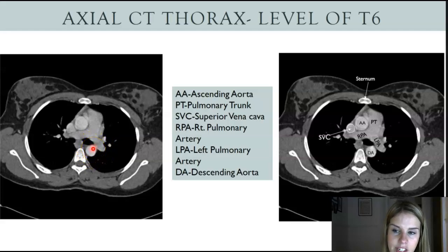It's still the same artery, it's just that because it curves, you're seeing it at one part of the curve, the ascending part, and then you're also catching it at the descending part as well, alright? And that's because it goes in an arch. What else have I missed?